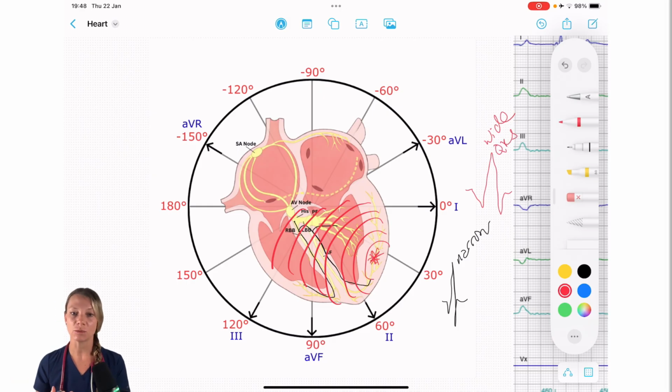As mentioned, in cats with complete heart block, the escape rhythm is most often junctional. So in this case, the narrow QRS complex does not indicate normal AV conduction. It indicates that ventricular activation occurs from a junctional pacemaker.